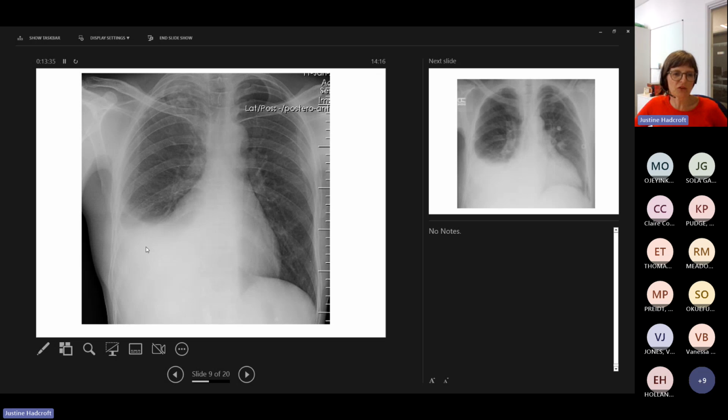And can you remember the last few X-rays you've seen? You can see ribs behind. You can just about see them maybe here, but generally this is so dense that you can't actually see much behind it. So this is fluid density. This is really, really fluid. So this would be a right-sided pleural effusion. And there's no obvious masses or consolidation above that might explain that effusion, but that's a pleural effusion, and you'd have to think about what the cause of that might be and whether it needs further investigation.